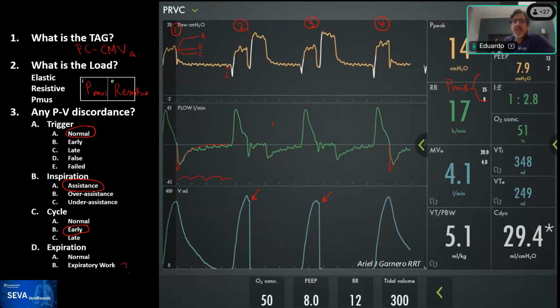This is where an EDI, an electrical activity of the diaphragm, or an esophageal catheter really helps clean out what is actually happening in these patients. Not that you need to put it in for this. Usually, this just requires some changes on the inspiratory time and perhaps changing the type of mode if it's feasible, depending on the goal for this patient. But that would be the gold standard when you see something beyond the waves on their own.